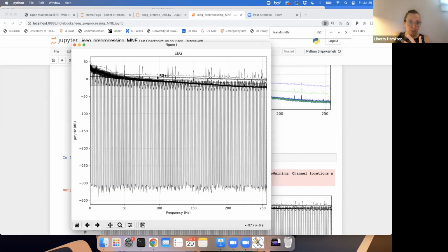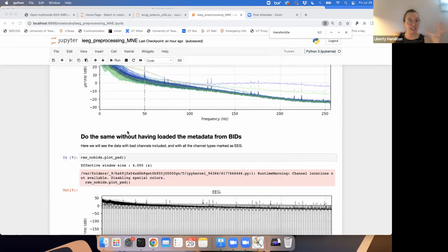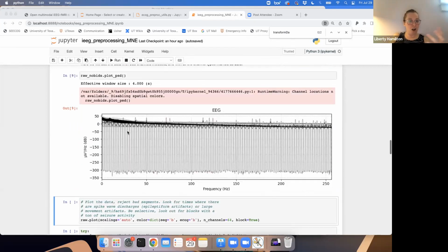So I'm just clicking on some other ones that are high up as well. And it looks like that's R3+, T03, P41. There's another oscillatory one, Abdo plus, so some abdomen electrode. And so I'm going to close that, but this is what this can look like if you are just working with kind of not annotated data.